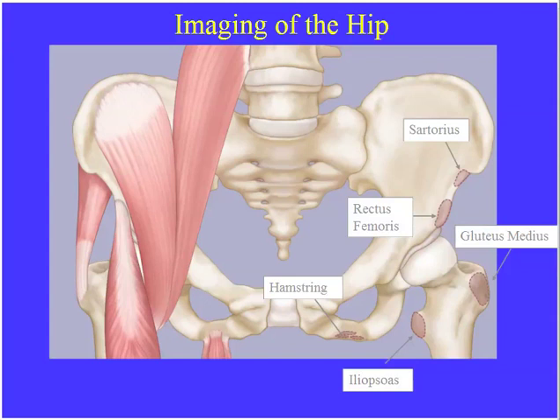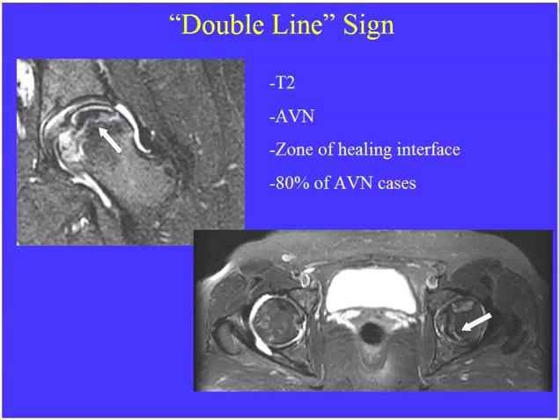And we'll just start by reviewing the anatomy, some of the insertion sites where we can see some avulsion fractures. Anterior superior iliac spine is where the sartorius inserts. Anterior inferior iliac spine is the rectus femoris, gluteus medius, greater troch, lesser trochs, iliopsoas. Then we have the hamstrings on the ischial tuberosity. And they like to show these avulsion injuries either on plain film or MR, and either ask what the tendon is that's avulsed.